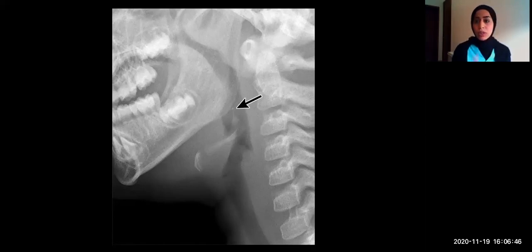Anything other than that should raise a suspicion for you as a general practitioner or pediatrician that this may be a radio-opaque foreign body. But unfortunately, these days a lot of foreign bodies are radiolucent, and bronchoscopy or CT may be needed for further assessment of these patients.